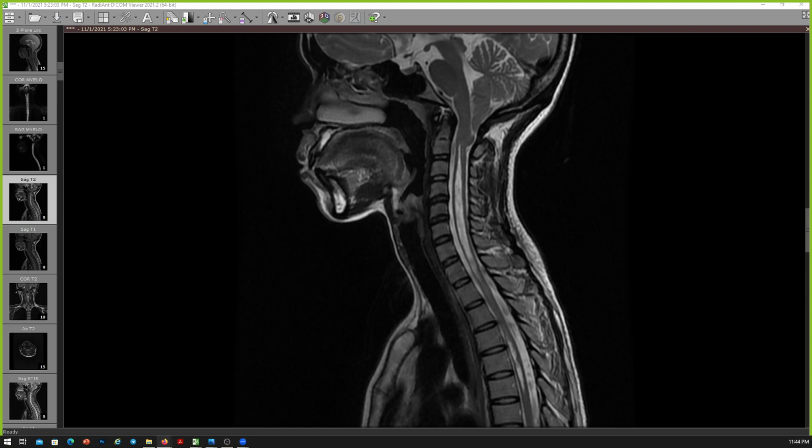So we'll wrap up the cases for you. Well done, candidate 2. You're very clear and confident. I'll just go through the cases and then give you the feedback. So this was a simple case. Sometimes they'll give you this case as the first case to just warm you up. So this is a Chiari-1 malformation.